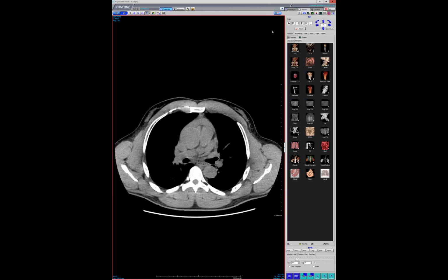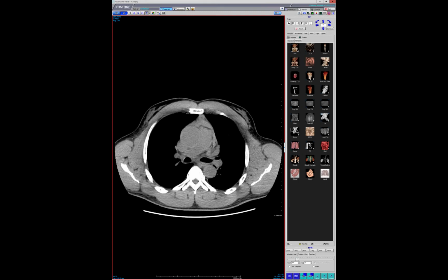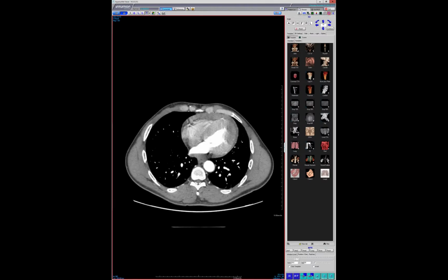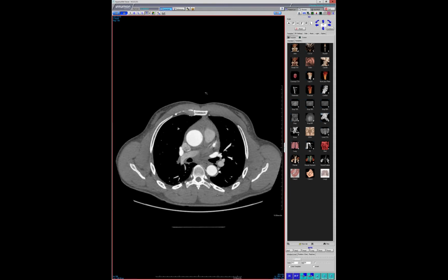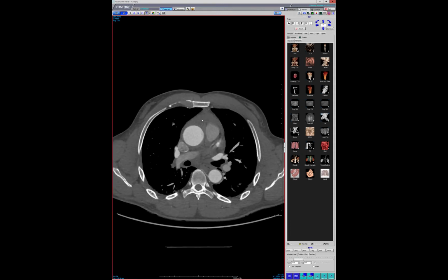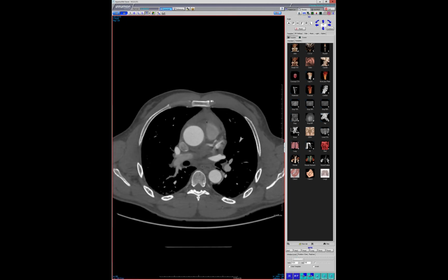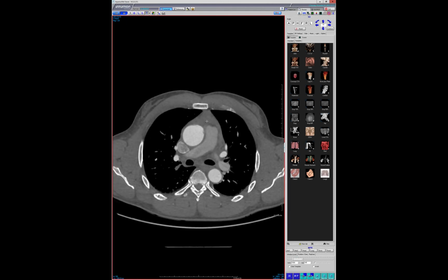He said it's really not rupture, and you can actually see blood along the PA here. He says, and I'll take his word for it because I didn't know this, that the intima is the only portion of the aortic wall that's waterproof, and the media and the adventitia are somewhat porous compared to the intima.